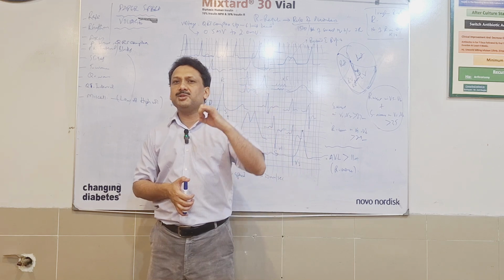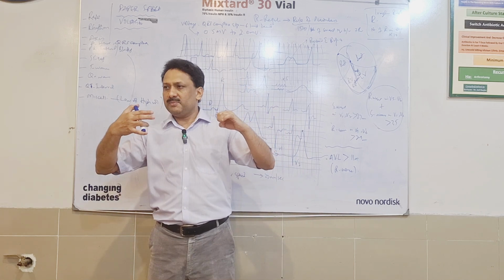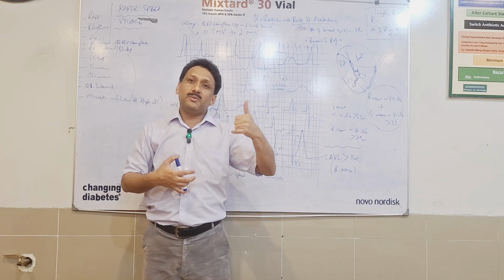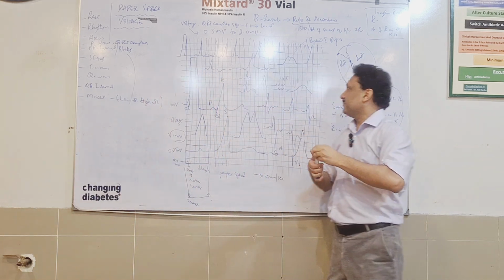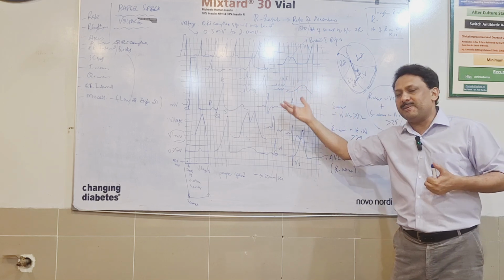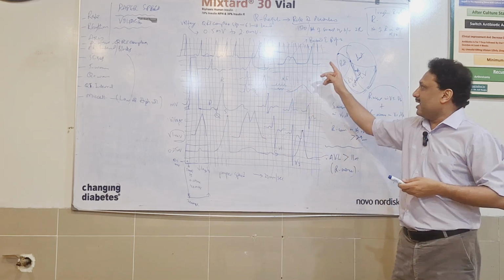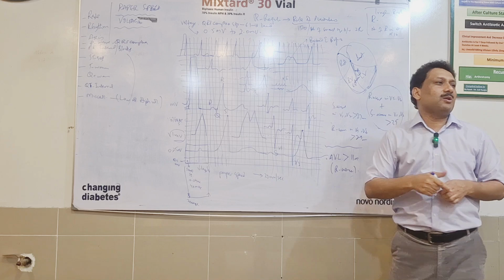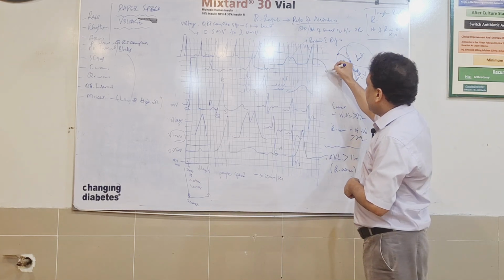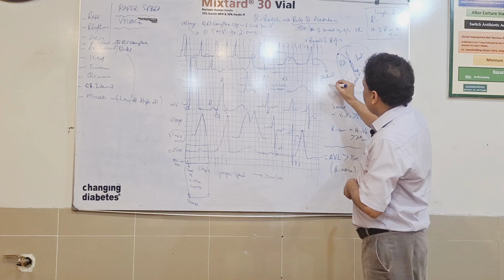So this pulmonary hypertension will lead to what? Back pressure. Where will be the back pressure? On the right atria. And how right atria it is represented by? Again, P wave would be depicting us about the atria. And if this is peaked like that, we will call it P pulmonale. So this is peaked and we call it P pulmonale.